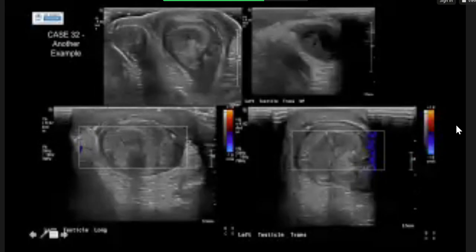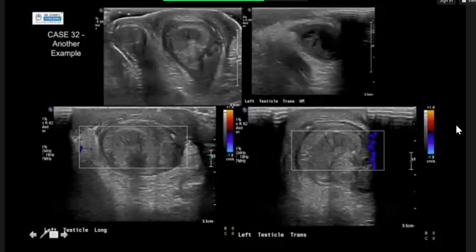And the ultrasound can show, so this is a normal right testicle here, and then this is the left testicle. You can see that you've got a really heterogeneous testicle with areas of hypoechogenicity and increased echogenicity. We've got edema of the scrotal soft tissues on the left hemiscrotum. We've got an absence of flow here, and then here we've got a hydrocele with some echoes within it, around that left testicle. So this is a case of a missed or delayed presentation where you've got a necrotic testicle.